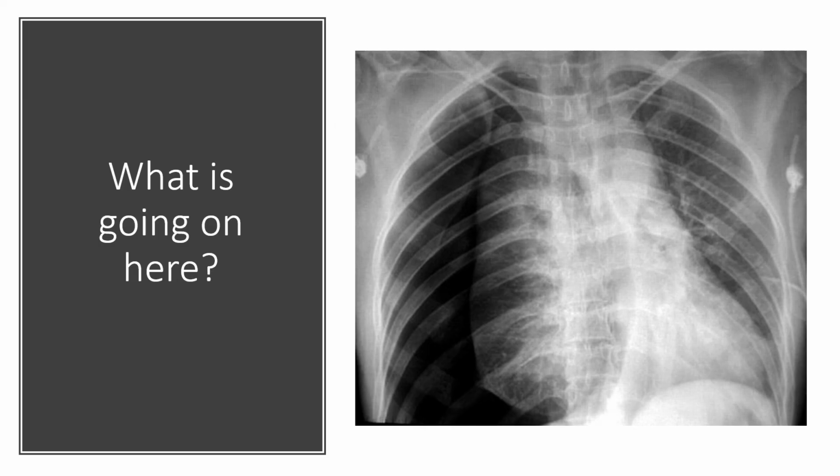Alright, so this is the fun part where I get to ask you what's going on here. So here's the question. What's going on here? It's a pretty significant thing, right? Here's a hint. They have hemodynamic changes with this. Hopefully you can see this. Alright, I'm going to start off by highlighting their trachea for you, if I can. It's all the way over here. Yep. This is their heart. Here, let's go to yellow. This is their heart.